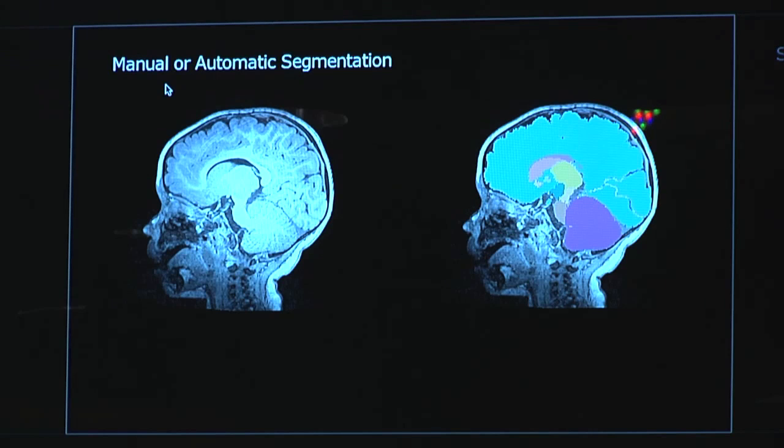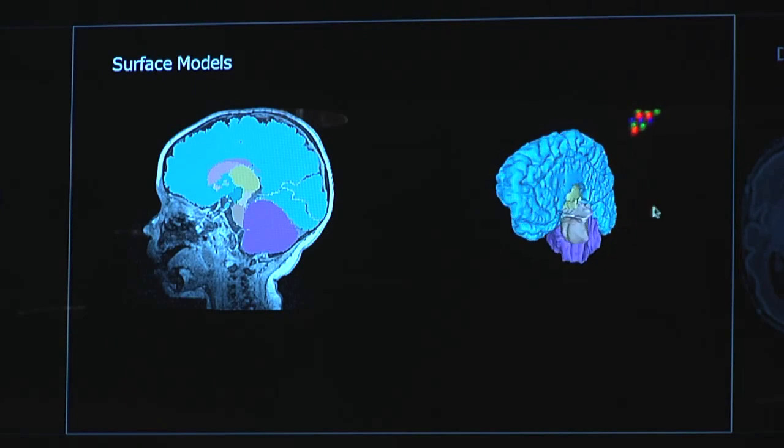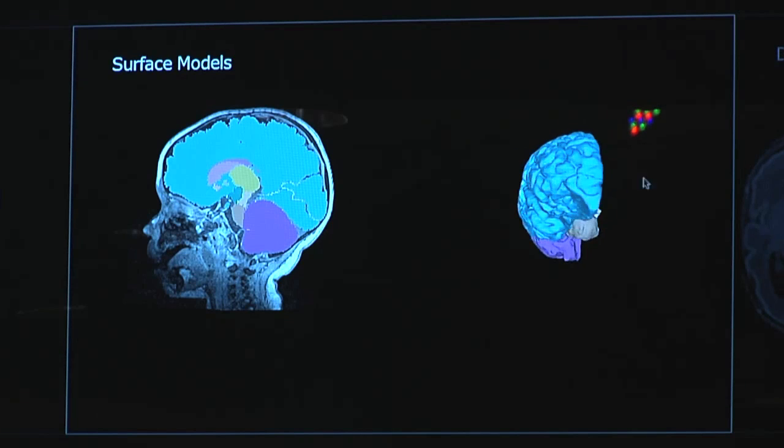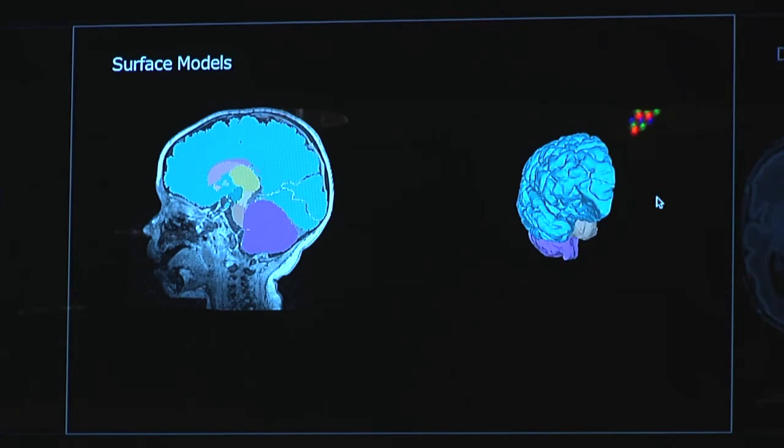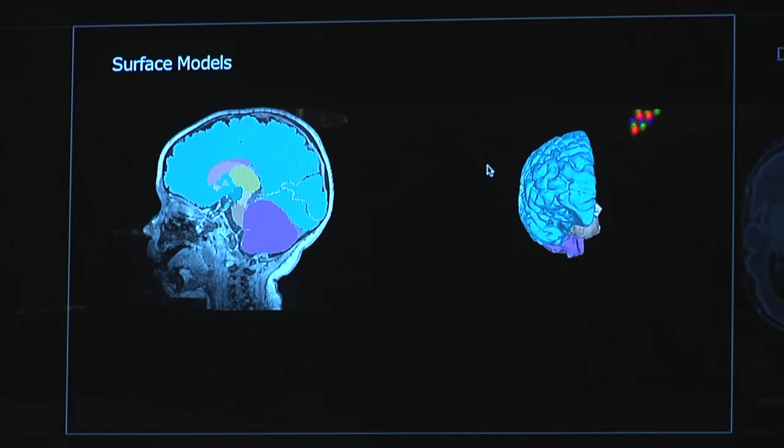So once you have a label map like that, you can use the marching cubes algorithm to generate three-dimensional surface models. This one is WebGL again. You can see that's the brain hemisphere of this guy we just saw in the volume rendering.